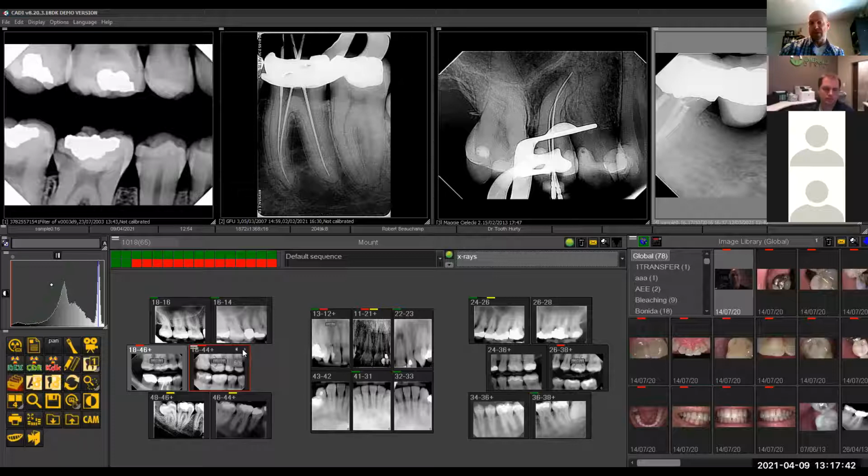There are two ways you can access them. It's either through the arrows, where if you put your mouse on the arrow, it'll tell you what it is when you click on it. So this is 6 of 6. If you click the other way, 5 of 6, 4 of 6. But another way that we like to do it is you just hold your left mouse button for a second.